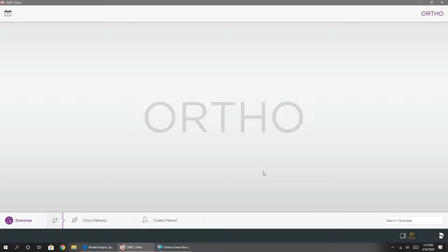Now, obviously, with the power of Primescan, we now have Ortho 2.0, which is a fantastic offering not only for the more advanced general dentist that's looking to do aligner therapies, but also for the specialist orthodontist that's looking to get the measurement, analysis, and treatment outcome simulations that this software can now provide. So, without further ado, I'll go ahead and jump into this software and give you a little start-to-finish demo.